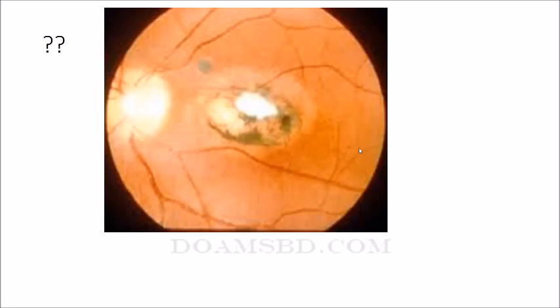So this is choroidoretinitis. And Dr. Pariali said in etiology, it could be toxoplasmosis. But can you say what the very characteristic feature is to say it is toxoplasmosis, Dr. Pariali? Chorioretinitis will be the feature. Yes.